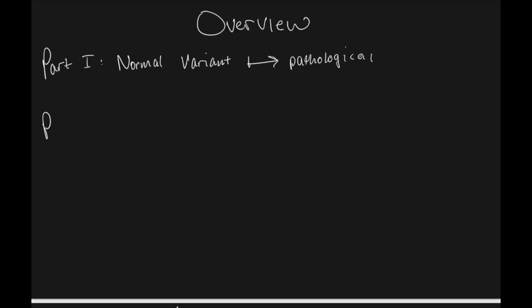In the second part of this video, we are going to look at 10 examples. And I think by the time we get to the second part of this video, you're going to be surprised and hopefully happy with how much you can point out on a 12 lead.